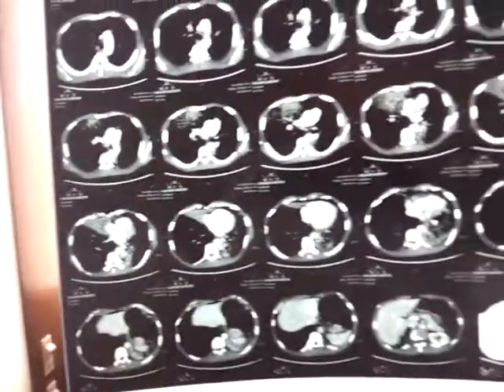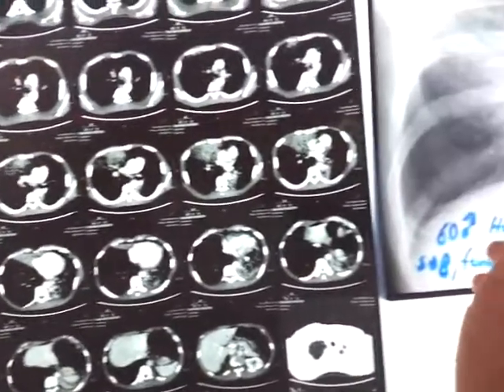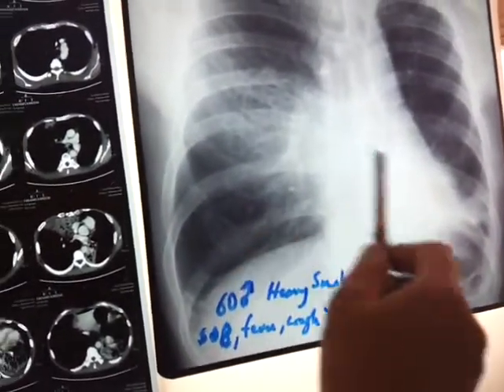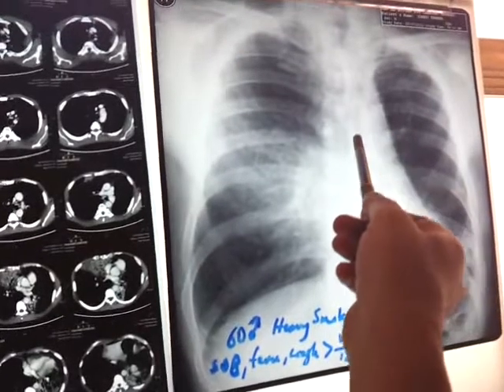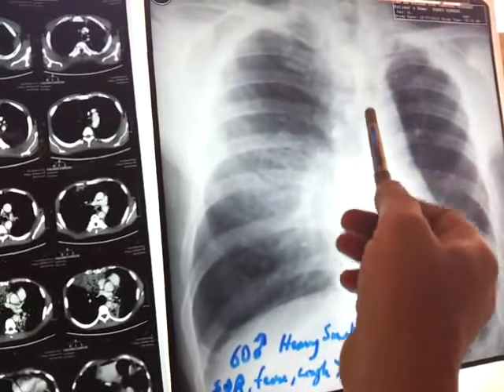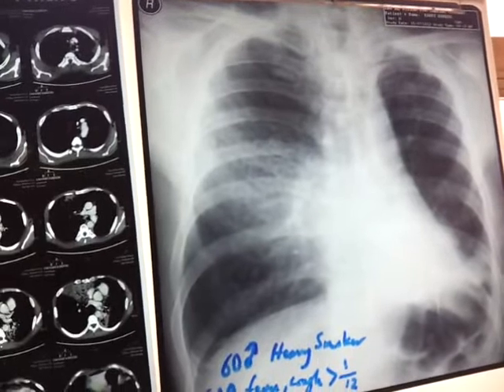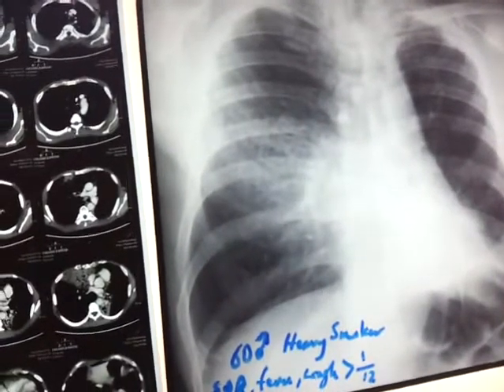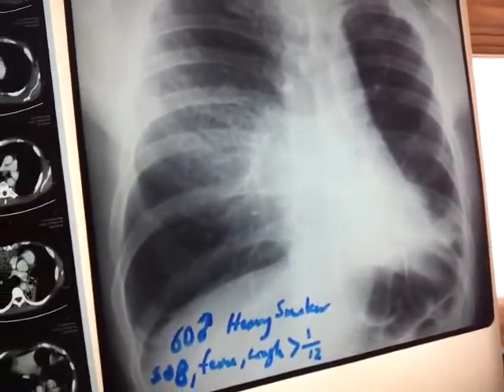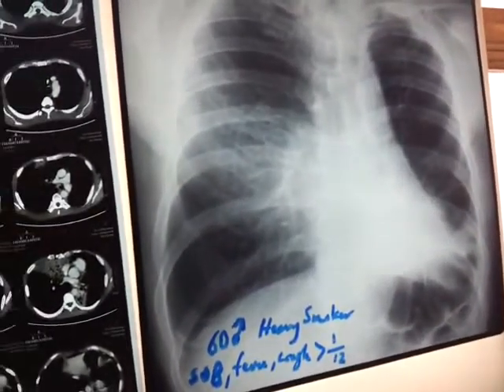Infection, streptococcal pneumonia, or pneumococcal pneumonia. This is infection, and this is also infection there and infection there in the patient. Probably he is immune compromised. Probably, especially if you have any element of immune compromise, you will get a widespread pneumonia. Because he is elderly and we are in the summer part, therefore most probably this is what? Legionella? Yes, and in the lower part you should think of Legionella.